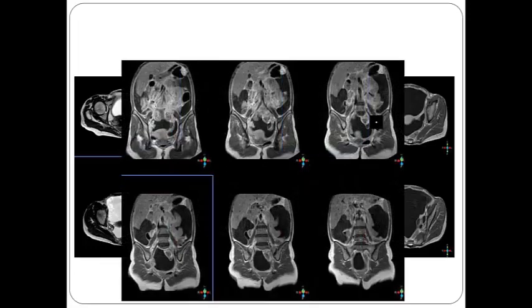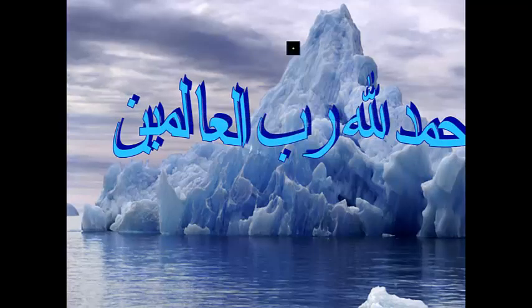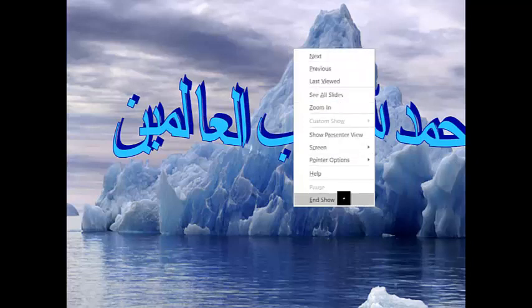Here, this is the ovary adherent to the wall of the pelvis, taking enhancement and rather bulky for age. So this is a Krukenberg tumor. Thank you for listening, and I think these will be helpful cases in your practice.